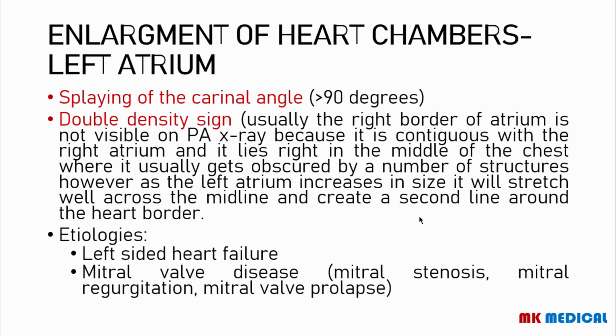You could have enlargement of the left atrium. If you have enlargement of the left atrium, you're going to be having splaying of the carina angle. So the angle will be greater than 90 degrees. I already showed you an image of that with that patient that had the valve replacement. You may also have what is known as a double density sign.